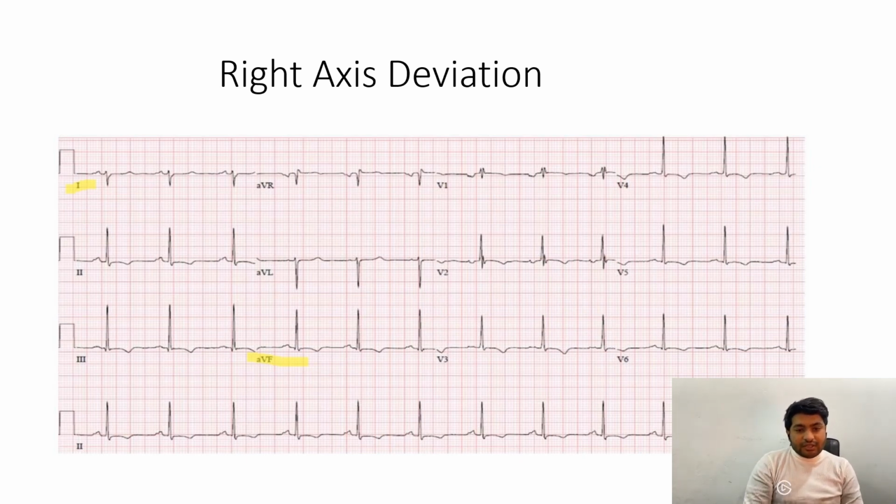So this is the easiest way that you can tell what the axis of an ECG is.